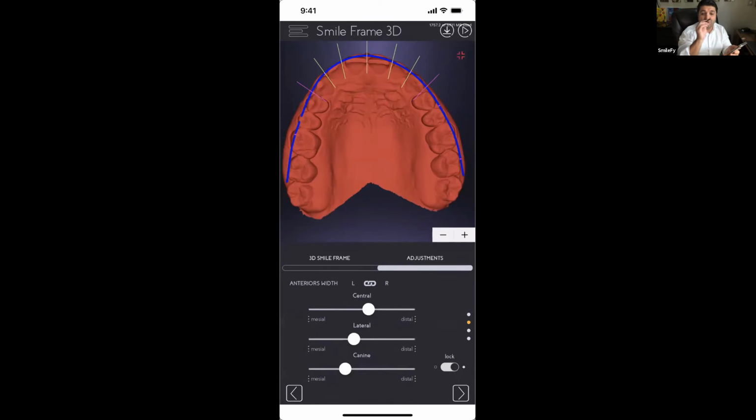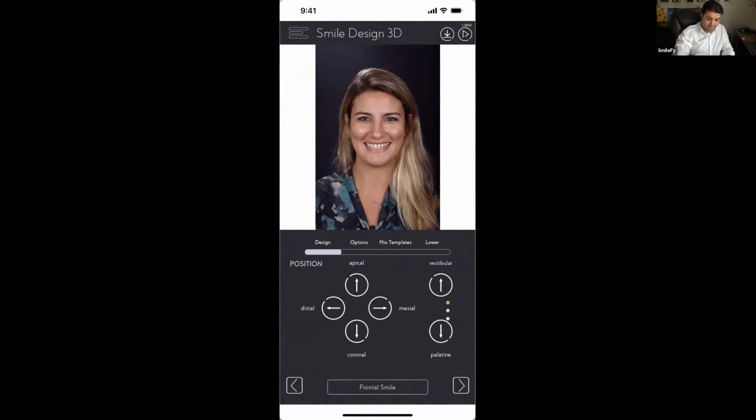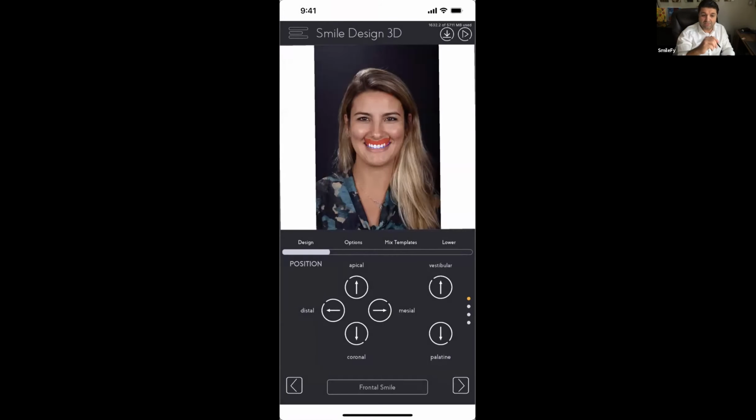And I don't need to go tooth by tooth and adjust the width of everything, because we should calculate automatically in the space our 6 teeth based on the occlusal curve. Done, right? That's the beauty of automation. That's the beauty of everything what we do. Now I know there is a little thing here that doesn't work, like it's the next button. So I need to click several times so that we move to the next screen.